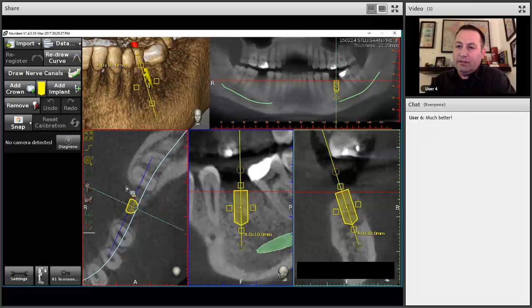So you can note here on the lower right corner of the panoramic view, you can see this blinking red dot. This is a new indication. We had the option of recording the screen before, but now we have that indication.